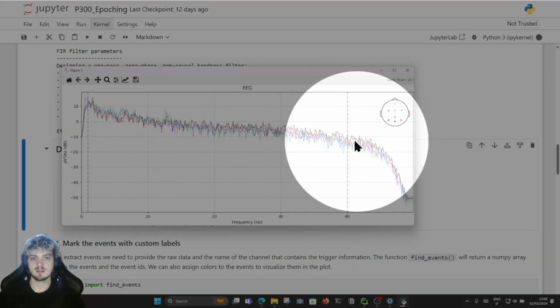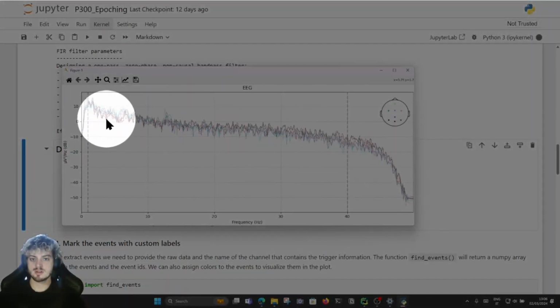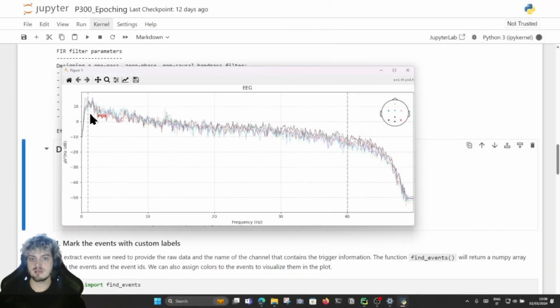Movement and some higher cognition functions are in the gamma waves, but so are many artifacts due to this type of task. Others study sleep, and sleep is usually in delta waves, but delta waves contain large drift artifacts. So if you're not sleeping and you're actually doing some tasks, delta waves normally do not contain useful information, so we get rid of them.